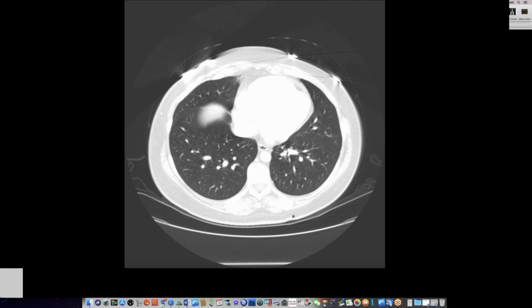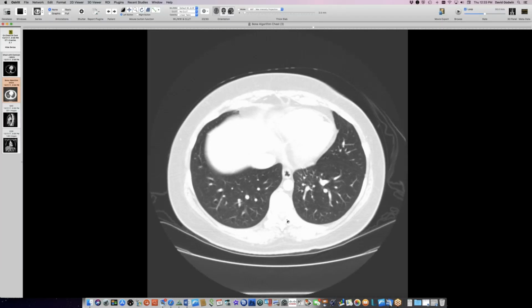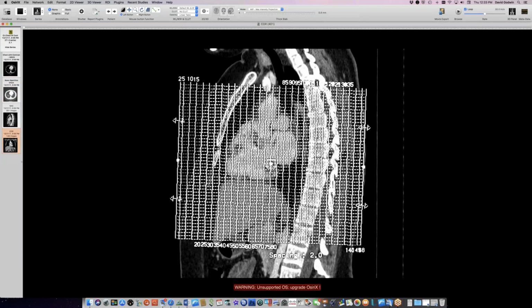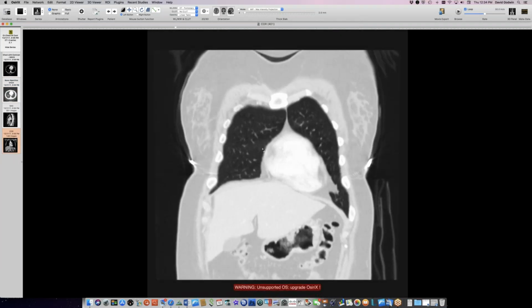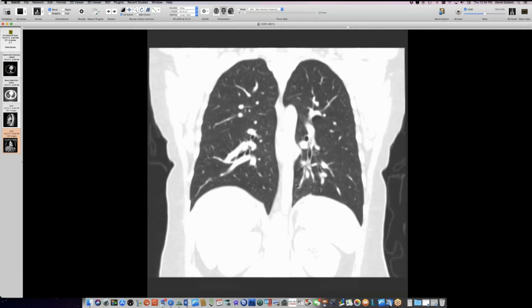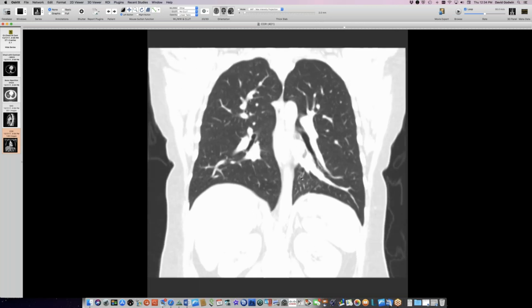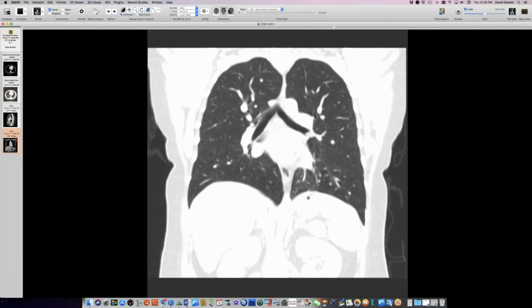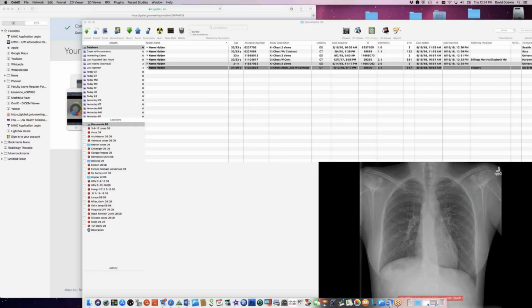I see this more often on the right than the left. I don't know whether that's your experience as well. So it's an isolated congenital anomaly here of systemic arterial supply to part of the lung. And here's what it looks like on coronal. Again, not the world's sharpest coronal here, but you see an excess number of small vessels down there reflecting this, I think, higher pressure perfusion than normal. Was this just an incidentalloma? Yes, I think so. I don't know what drove the CT scan, what the symptoms were at the time. So I haven't researched this case fully.